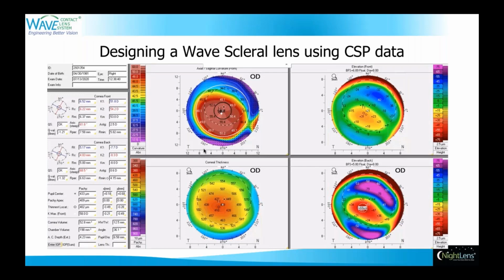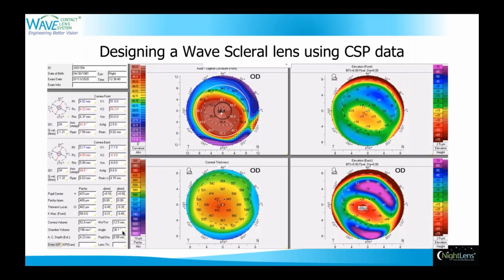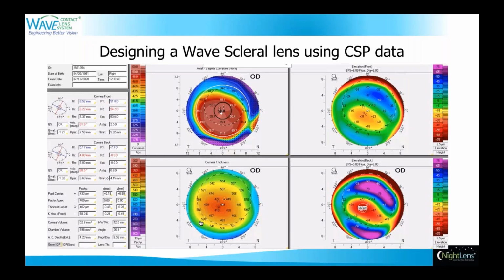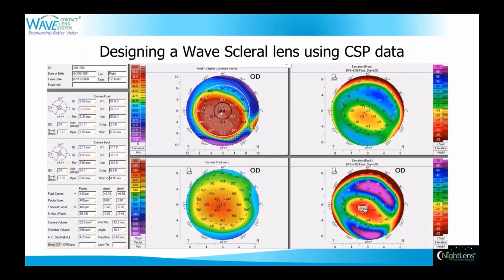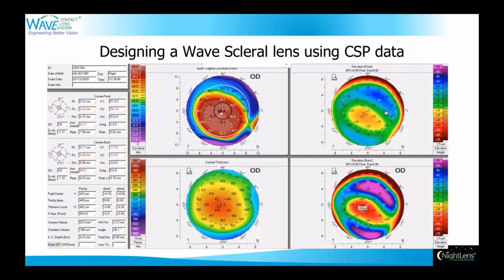But the Pentacam offers so much more than just a picture of the sclera. And this picture kind of highlights that. We manage quite a few keratoconus patients in the office. And these days, with the advent of cross-linking, you can't have an intelligent conversation with your patients, whether they need it or they're stable after their cross-linking, if you don't have the posterior float. So this picture over here to the right bottom is an elevation map. It's actually a best fit sphere showing you the elevation of the back curvature of the cornea, the back float. And the picture up above, of course, is the same thing, only the front surface of the cornea.